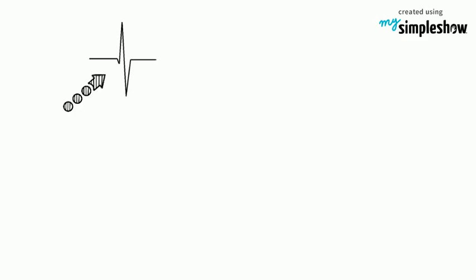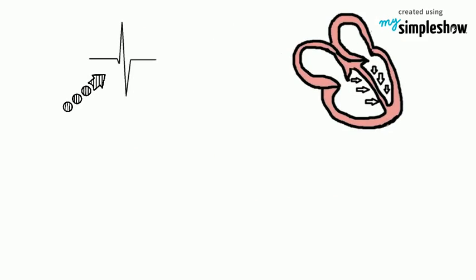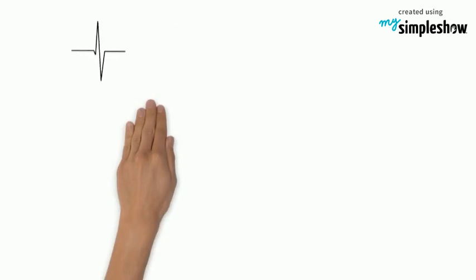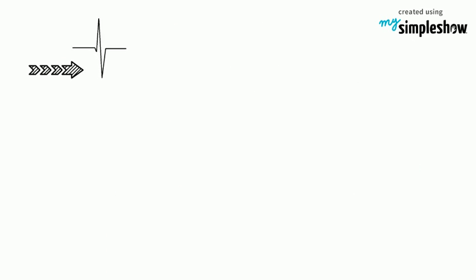In this, the Q wave represents the contraction of the septum and it is a negative wave. The R wave occurs due to the traveling of electrical potential to the apex of the ventricle. The S wave occurs due to the potential traveling to the base of the ventricle.